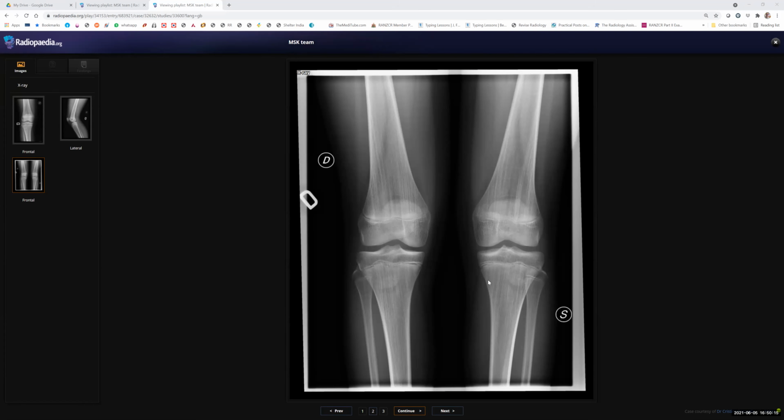The patient came after a history of trauma, but there are no fractures. There are regular linear bands of radio-opacity extending vertically from the metaphysis into the diaphysis of the femur, tibia and fibula. They are bilaterally symmetrical, so that is benign and is called osteopathia striata. Nothing to do.